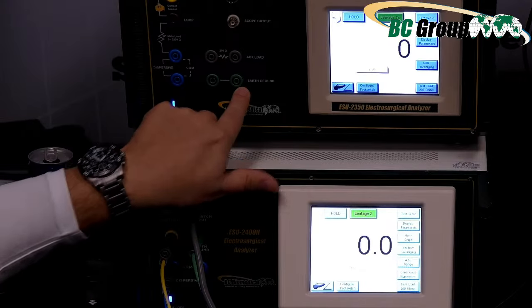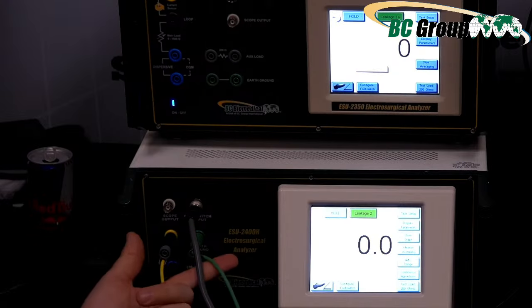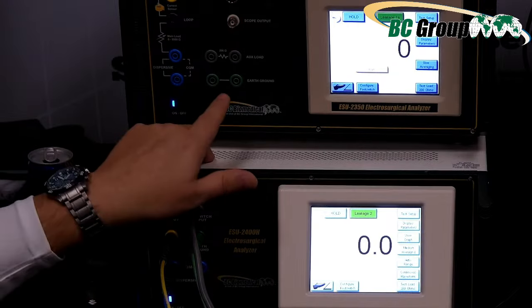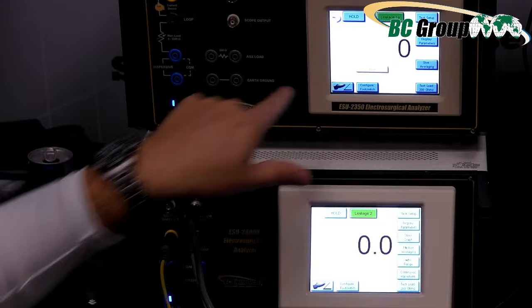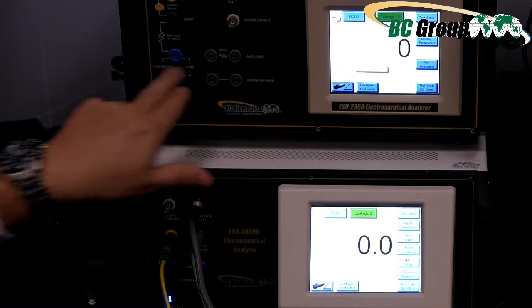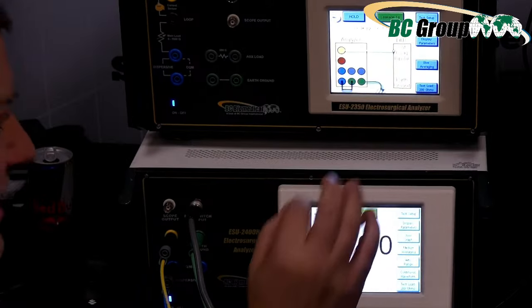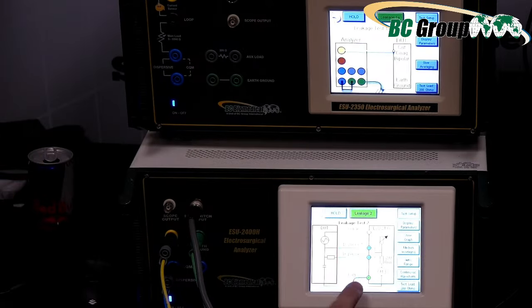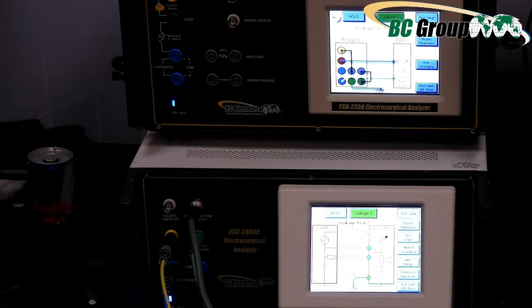And then down here, we have 2 earth, whereas this we have only a single earth down here. We're going to show you that you're going to have an extra cable for that earth because one of them is going to connect over here to this guy, but the other one's going to connect over here for current. So let's go ahead and let's take a look at the exact same test. Leakage 2, down here, you can see it required 3 cables. Up here, leakage 2. Let's see exactly what's required for these 2.